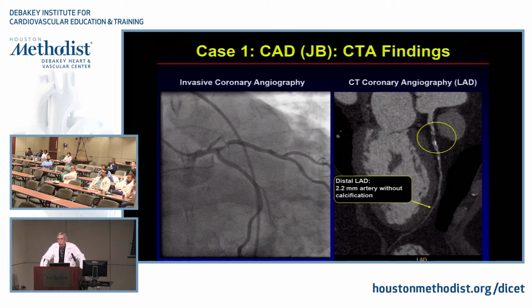And by the Cath alone, it would have been very difficult to determine that. CT is more and more being used to look at arteries that aren't well visualized distally on catheterization. So what is the technical explanation for this? Yes. I mean, you're injecting directly in an artery. Yes. You barely see it. You're infusing dye intravenously, and you see it beautifully. Yes. So what's the technical explanation?